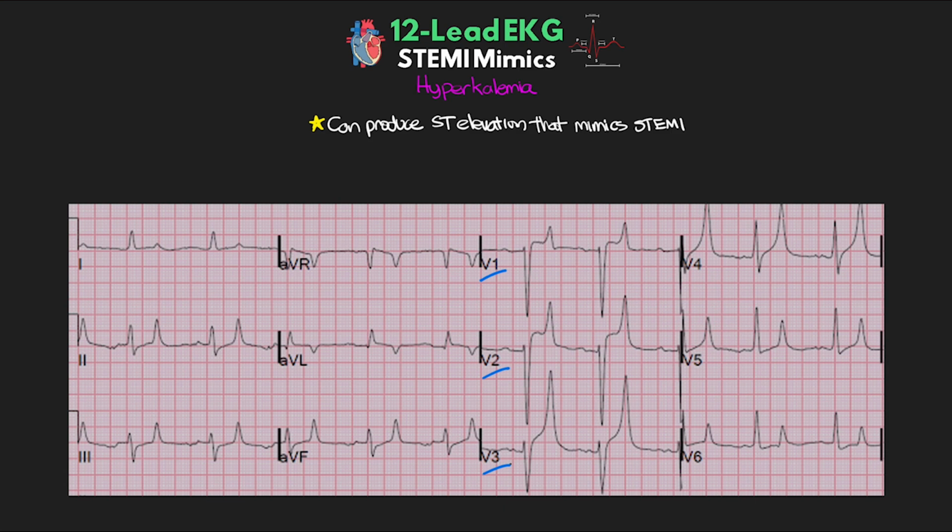Well, hopefully the T waves stand out for you here. And in many of the leads, we see these large, narrow peaked T waves, especially V2, V3, and V4. And this is going to be classic hyperkalemia, and thus the ST elevation was actually a result of this. And also note that we do still have that concave ST elevation.